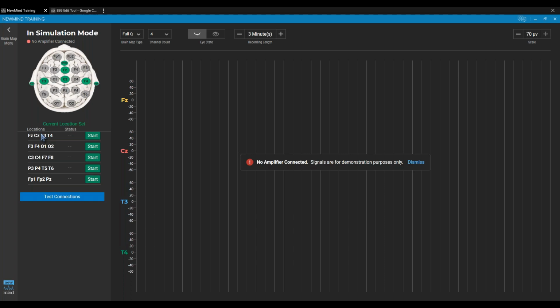If I bump that up to 5 minutes, now you're at 25 minutes, so you're pushing close to an hour-long appointment. So the 4-channel is going to take longer. It's just how it is. But if you add some extra time in, with a 3-minute recording you might be able to pull 30 seconds of data out of that. It's just hard to say.